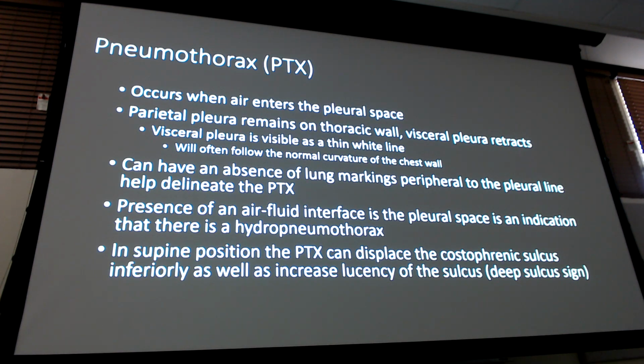If you have fluid and air in there, we saw that one picture, it's a hydropneumothorax because I have both, okay? And then we'll talk about that deep sulcus sign in a supine position. So if they're laying down instead of standing up, how that kind of presents itself so you have an idea what that looks like.